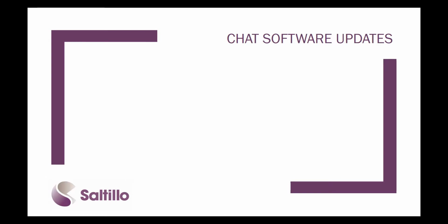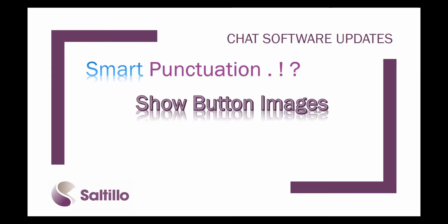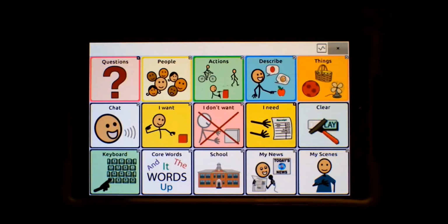A few changes were made to 2.11 chat software. Smart punctuation was added. What happens with images when Show Button Images is turned off was changed. And the process to copy a button style changed slightly. With the addition of smart punctuation, the software recognizes the punctuation and determines if a space is needed or if it needs to be removed. Previously, WordPower has been programmed with button actions to create smart punctuation. Now in vocabulary where punctuation is not present, we can simply program it in.